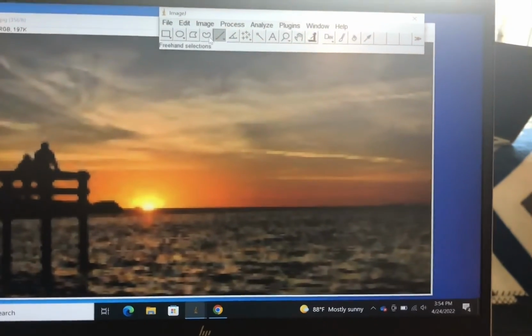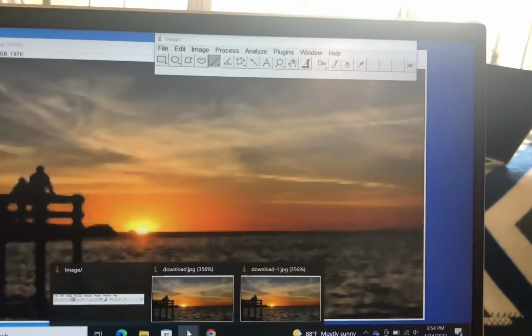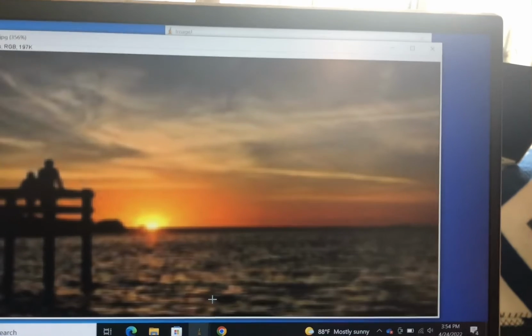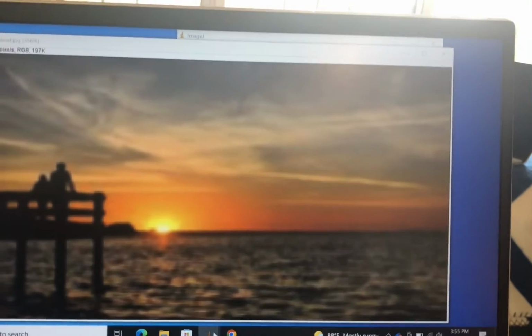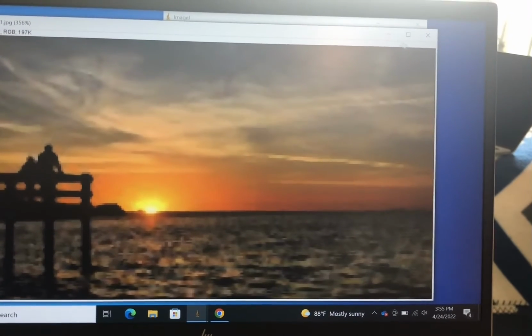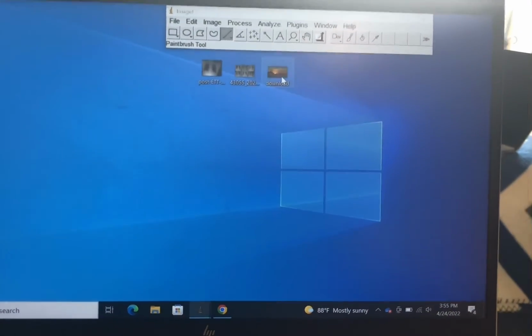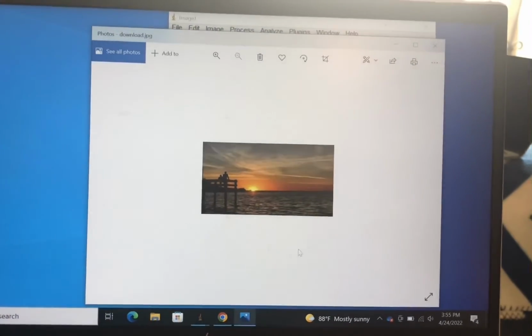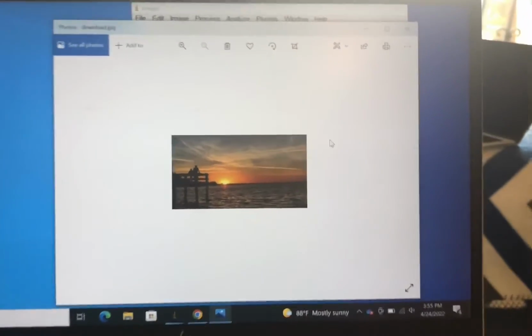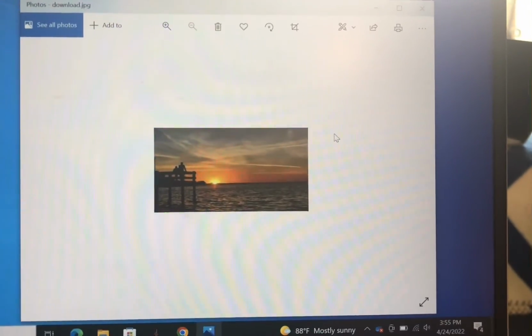So you can use these filters to clear your picture a little bit. And if you want to compare them side by side, here's the mean filter, and then here's the median filter. It's probably a little bit clearer. Okay, now these images are basically two-dimensional, meaning they're flat. They usually just use the XY axis, which is the height and length.